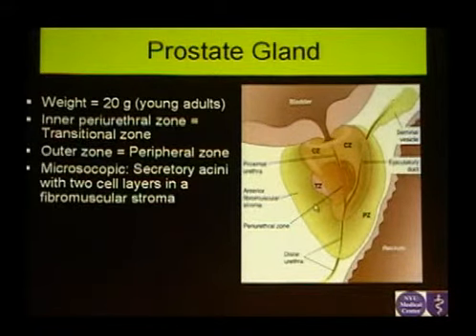20-25% arise in the central portions of the prostate. That's also extremely important to know. And also, I don't want to discourage you, but this is a very difficult location because it's mixed with BPH, and BPH has a very variable appearance and can sometimes make it very difficult to diagnose cancer in the central gland. On top of that, urologists, when they do their biopsies for prostate cancer diagnosis, will usually not do biopsies of the central gland. Usually they will do biopsies of the peripheral zone and not go any deeper unless you tell them. This is the urethra in the middle.